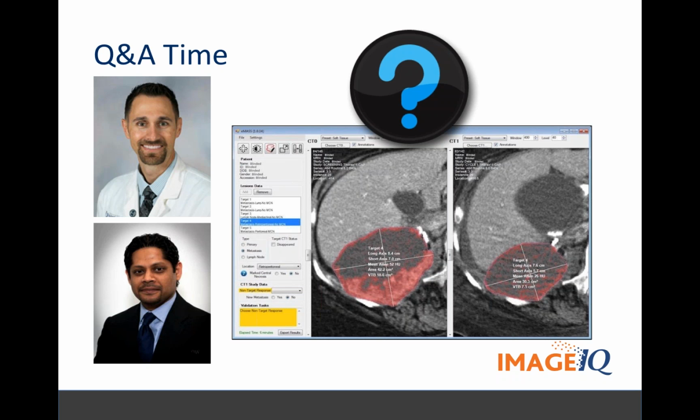And that's really helpful too. That allows us to get rid of the clip. So maybe the viewer saw, hey, you didn't get the clip there. That has to do with thresholding. We said, hey, that's too dense. That can't possibly be tumor. And we do the same thing on the low end. We don't include fat. We don't include air. We don't actually include water, which is part of why you're seeing all this necrotic portion not showing up in red on the image that's right in front of you right now. So that's a great question.